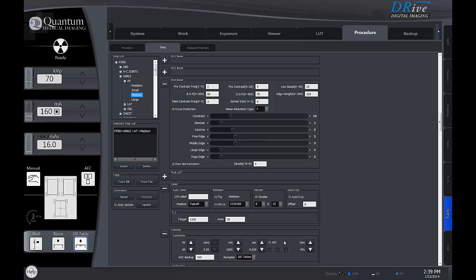Note for the large patient, ankle AP, for gadolinium panel, we have 65 kVp at 6 mAs. For the medium-sized patient, 60 kVp at 3 mAs, and the small patient, 55 kVp at 2 mAs. And all of those are defaulted to the tabletop mode. Note the exposure index for the gadolinium panel is defaulted to 1300, which applies to all extremities.